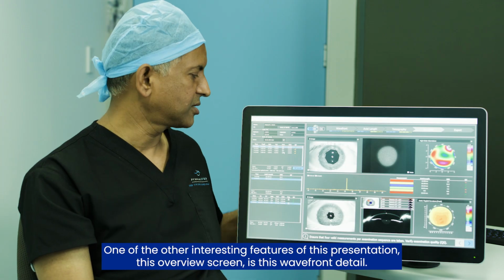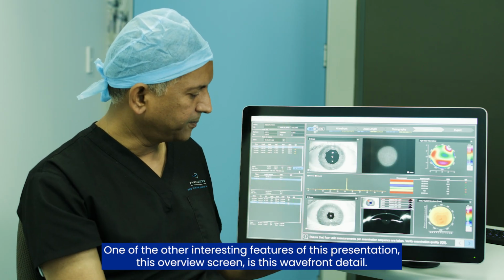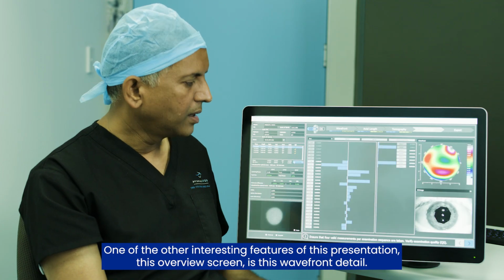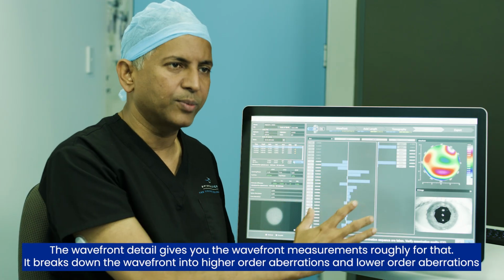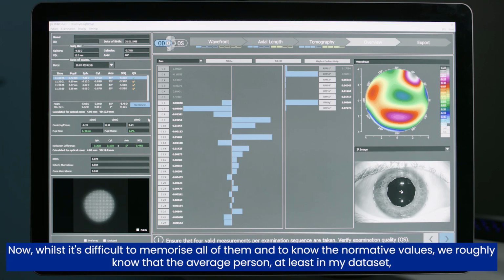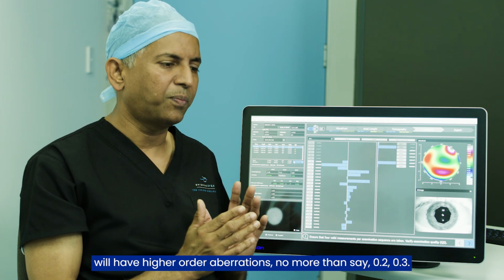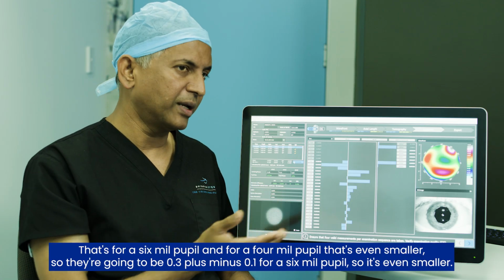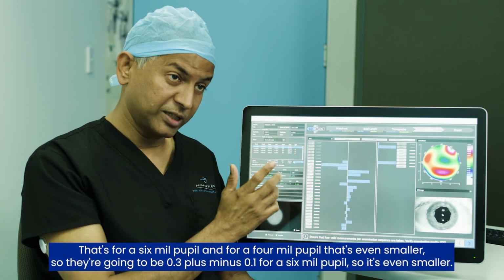One of the other interesting features of this overview screen is this wavefront detail. The wavefront detail gives you the wavefront measurements. It breaks down the wavefront into higher order aberrations and lower order aberrations. Now, whilst it's difficult to memorize all of them and to know the normative values, we roughly know that the average person, at least in my data set, will have higher order aberrations no more than, say, 0.2, 0.3. That's for a 6 mil pupil, and for a 4 mil pupil, that's even smaller. So they're going to be 0.3 plus minus 0.1 for a 6 mil pupil.